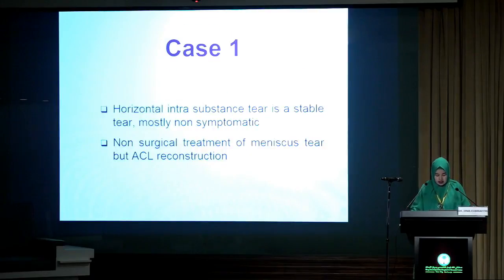Horizontal intrasubstance tear is a stable tear, mostly asymptomatic. Non-surgical treatment for the meniscus tear in this case, but ACL reconstruction.